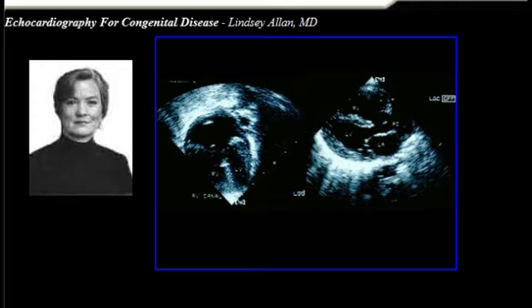Similarly, this is an example of tetralogy of Fallot. In the uncomplicated case, there's no reason why this needs cardiac catheterization prior to surgery in our practice at least.